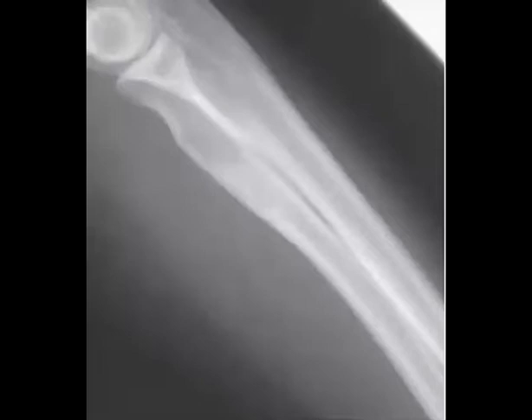So if we mention that it could be osteoid osteoma, where is it? Like Ala mentioned, where is the osteoid osteoma? Now I can tell you that the patient has pain, which is nocturnal pain, and this patient takes salicylates and it resolves, but the pain is recurrent. Until anyone can draw where it is, I will wait, but I can tell you that osteoid osteoma happens in the young male.